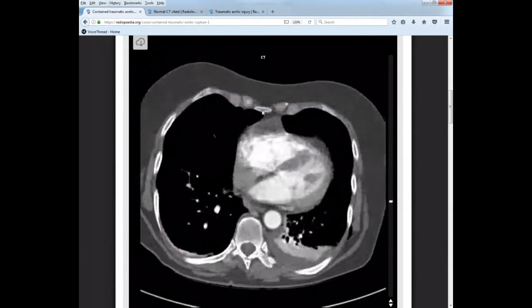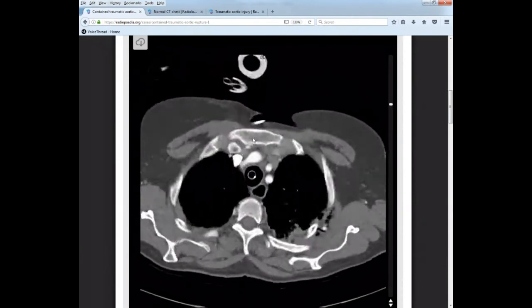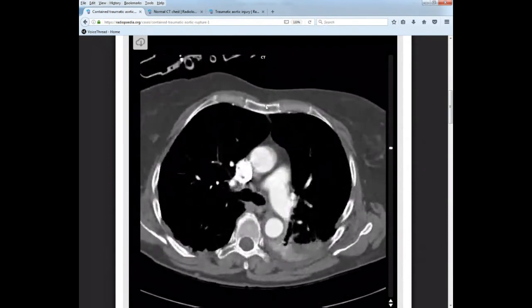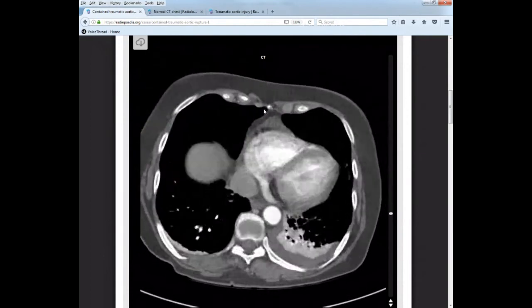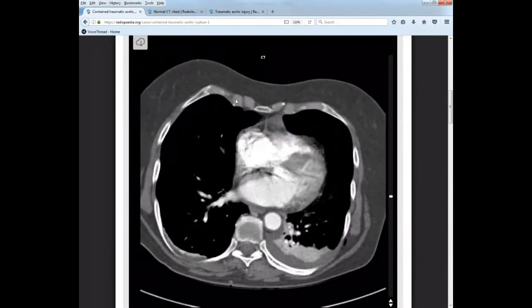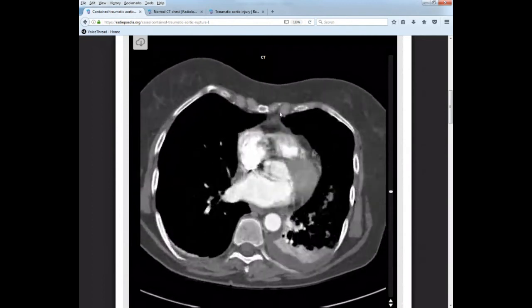Let's go back up and look at the manubrium. Manubrium right here. First segment, sternum coming down, body of the sternum, and then our little tiny poker down here is your xiphoid, okay? And then here's our costovertebral junction and attachments down here.